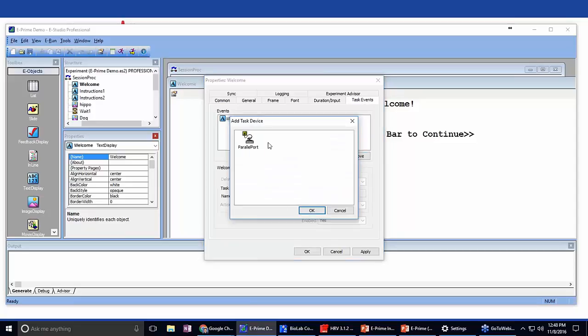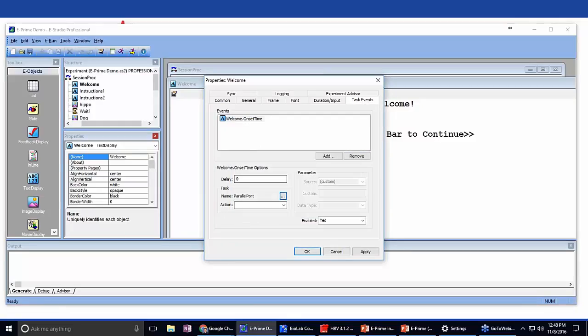It is available to me because I added it, so we simply double click on that. As soon as we do that, we're going to start opening up some of these grayed out windows. First one we're going to do is write a byte. For the value, again, I'm going to want to zero this out to make sure that I know where I'm starting from. And then finally, the data type is going to be byte. And that is all we need to do.